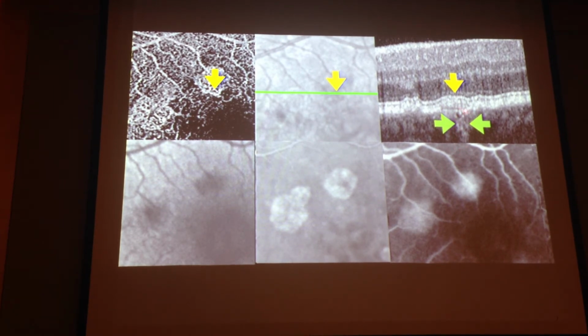It means that there is no RPE, but the photoreceptor is still there. The choriocapillaris is normal, so you actually have a window to the choriocapillaris, and this is why you see it quite nicely, like a net, your lesion. But in fact, it's a normal choriocapillaris seen better because there is no RPE masking it.